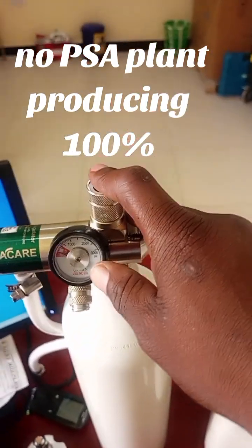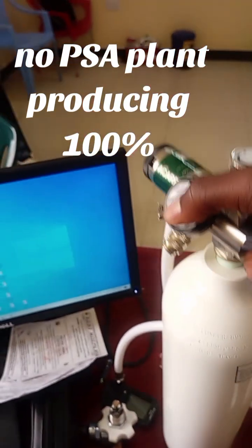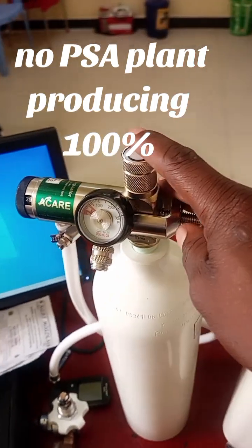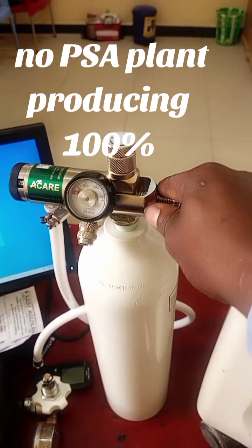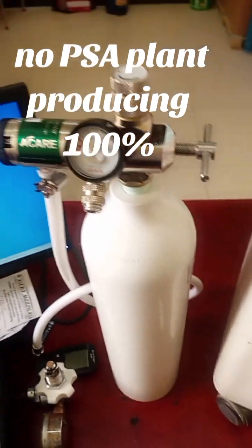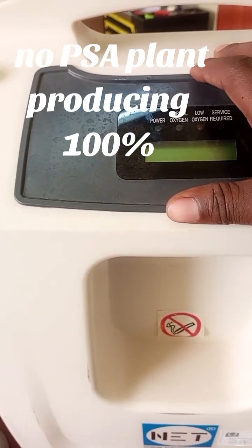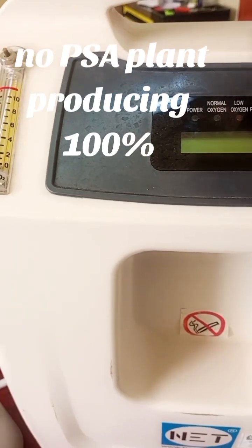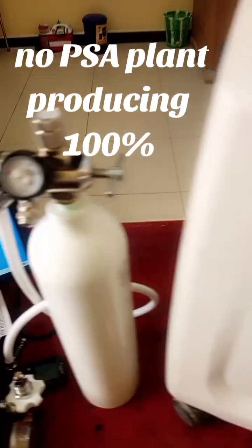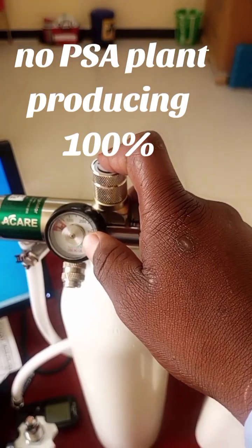Another thing, this is portable, because someone can handle it and walk with it. So when you are transferring the patient from one room to another, or from one hospital to another, you may use a small oxygen gas cylinder as the gas supply. Although in some circumstances we have a small oxygen concentrator that you may move with when you are taking patients from one room to another or from one hospital to another. But mostly people prefer this one, the already manufactured gas from the oxygen plant.